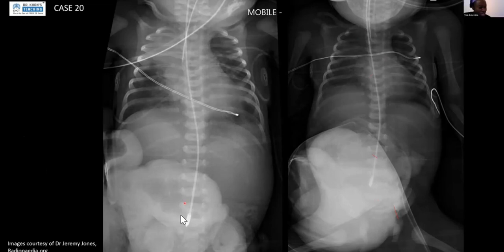Okay. What do you think it's going to? What line would you expect to go down the midline from the pharynx, across the diaphragm? An EVD line, extraventricular drainage. No, just a common line we put in neonates. Yeah. So this is an NG tube? Yeah, NG tube. Okay, so within the stomach. So if it's in the stomach, this would be a very distended stomach.